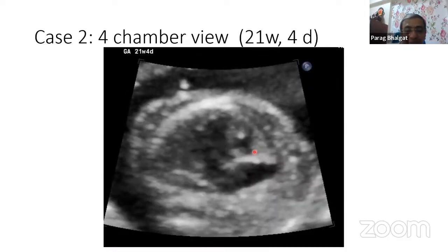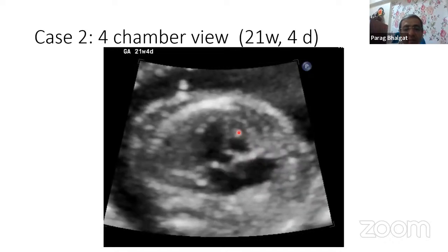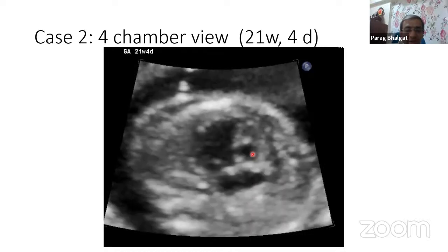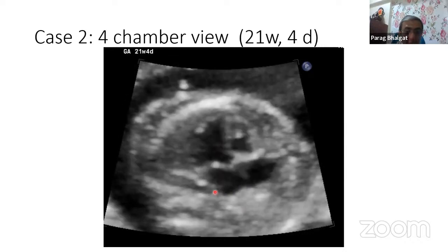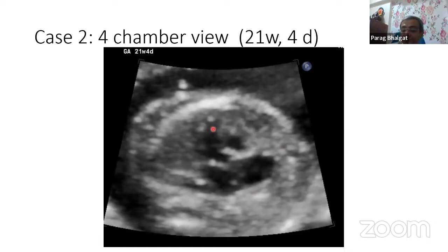Another patient. The RV is a little big, but is non-apex forming. The apical portion is highly trabeculated and small in size. The TV is difficult to appreciate. The tricuspid valve is here. LV, LA, and the rest are normal size. Spine, normal apex, normal cardiac axis.